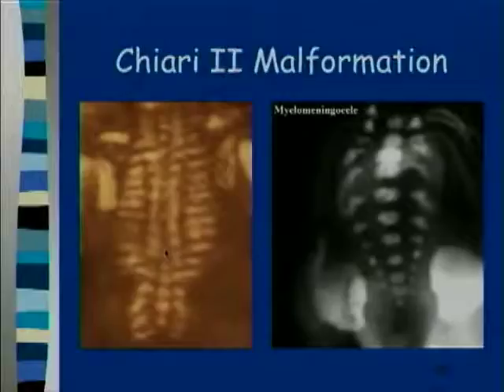So the rendered pictures, until you've seen quite a few rendered pictures, I really don't think that you should make your diagnosis predominantly from the rendered. It should be an adjunct to your 2D ultrasound, because on 2D, you can figure out the levels as well. You may not be perfect of which number it is, but you can see the widening. And here you can see on this patient the widening of the spine on the x-ray from after delivery.